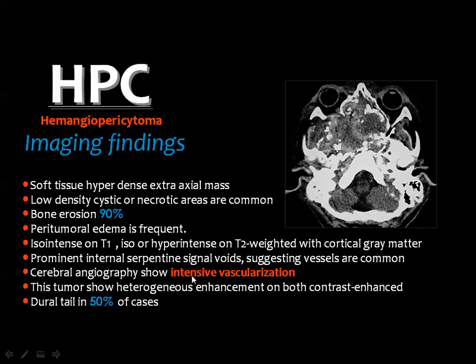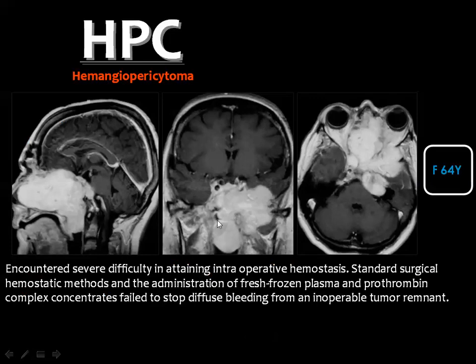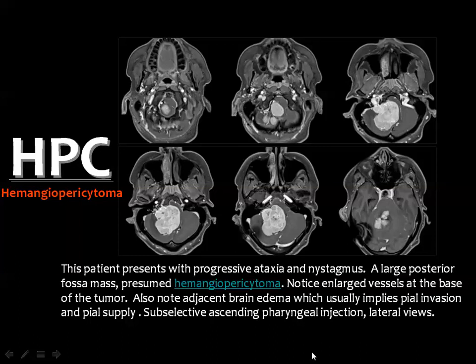And if you have an angiogram, either by CT or by MRI or by conventional angiography, then we see extensive hypervascularity. You see this tumor in the skull base, centered to the skull base. These are images obtained after contrast injection and can appreciate the intense homogeneous enhancement of the tumor with significant extension everywhere in the ethmoids, in the orbit, in the infratemporal fossa, in the parasellar area, in the nasopharynx.